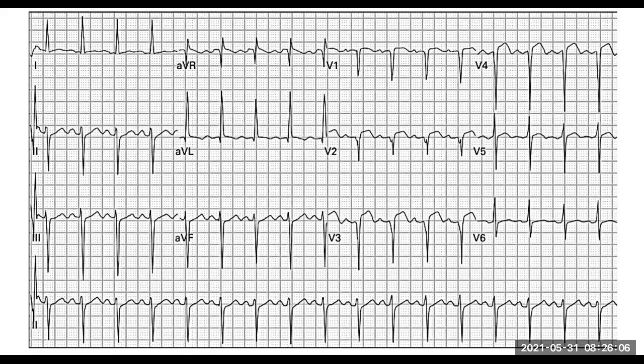So in other words, the first thing that you do is you go to this patient and say, okay, listen, I suspect it could be an infarct, guys. Let's put an ECG on. ECG takes us 5 minutes. We're going to analyze the ECG, and then we're going to decide what's going on.